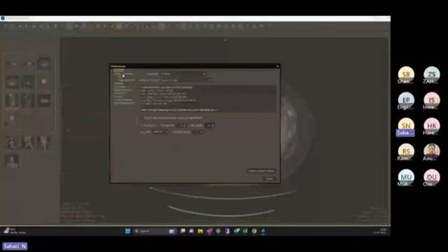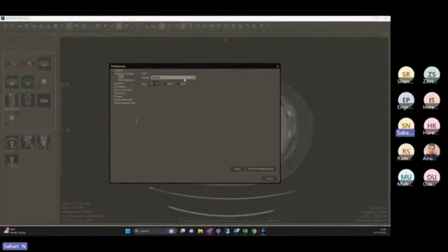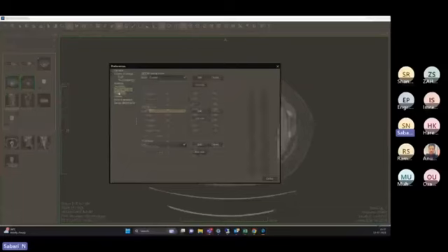All of this can be customized by each and every individual user: what kind of font size they want, what kind of pixel. If they are using multiple monitors, as you see, the radiologist always has multiple monitors, one normal reporting monitor and two medical grade monitors. So the reporting window has to be open on the normal monitor, and those settings we can do here. If there are any DICOM multiple PACS servers, yes, we can add these multiple PACS servers here and view the images.